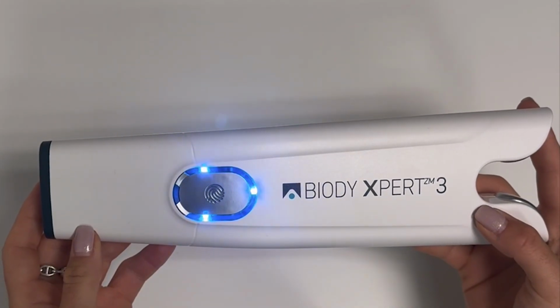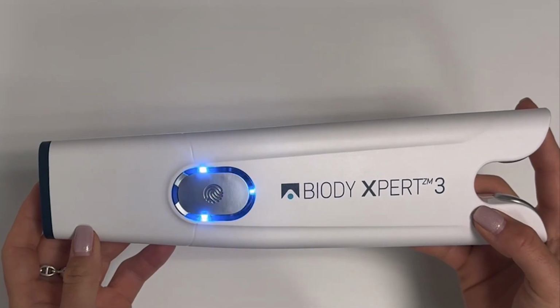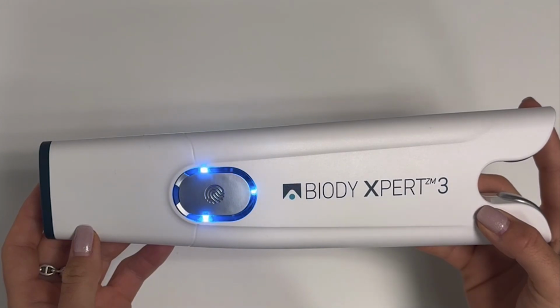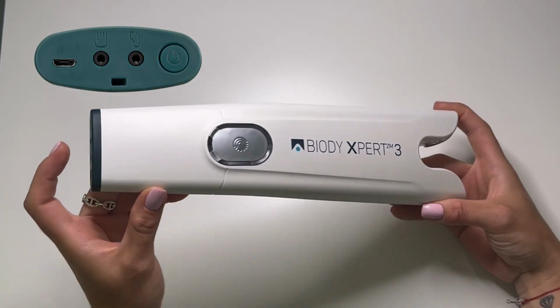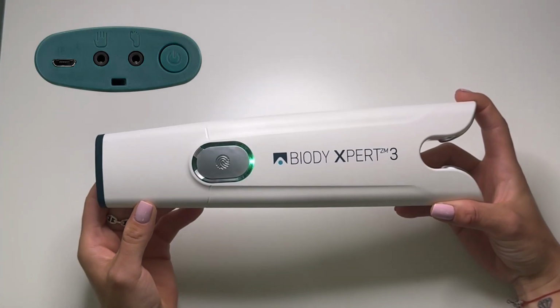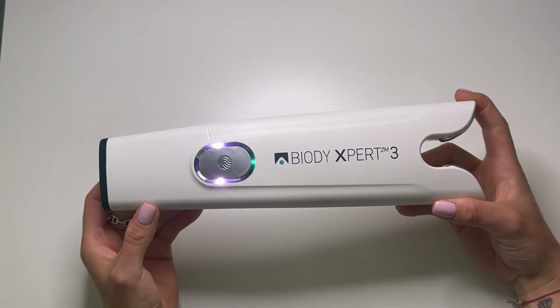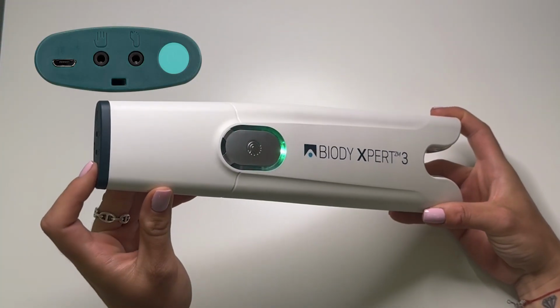When the measurement is complete, the device indicates that it is ready to pair via Bluetooth. Bluetooth communication enabled. You have 1 minute to proceed with the measurement. Otherwise, your measurement is saved in the device. To retrieve it, turn the device back on. Your device contains unsynchronized measurements. Press the power button twice to reactivate Bluetooth and transmit the data.